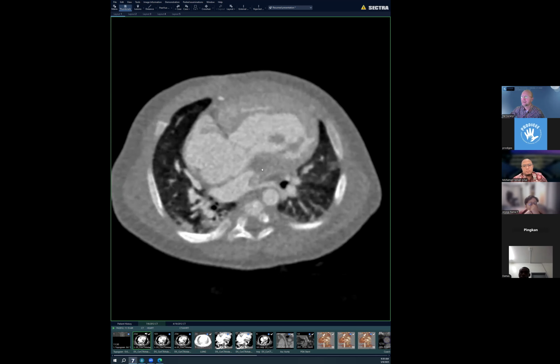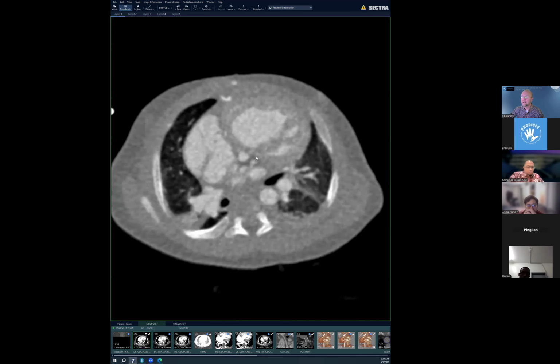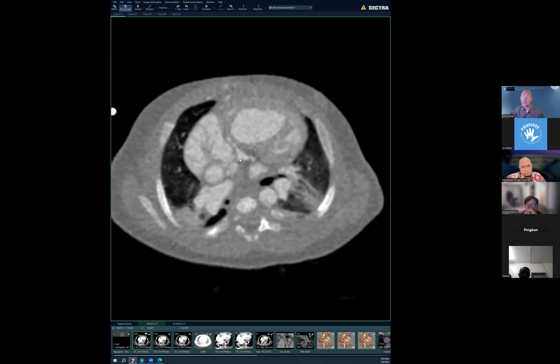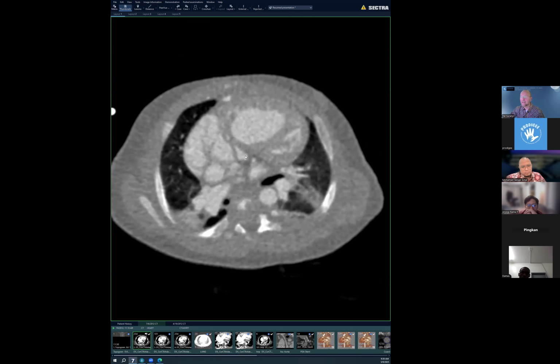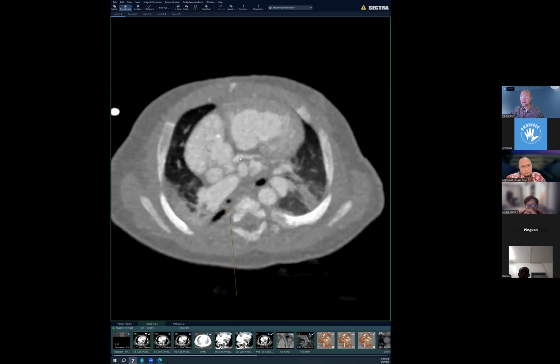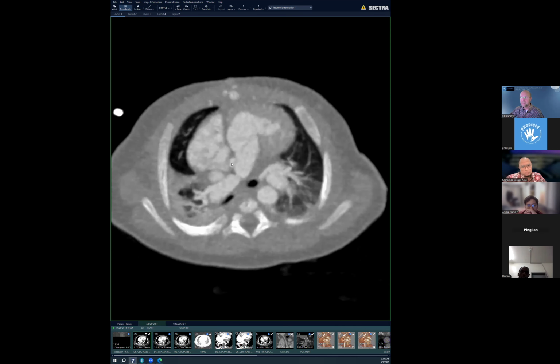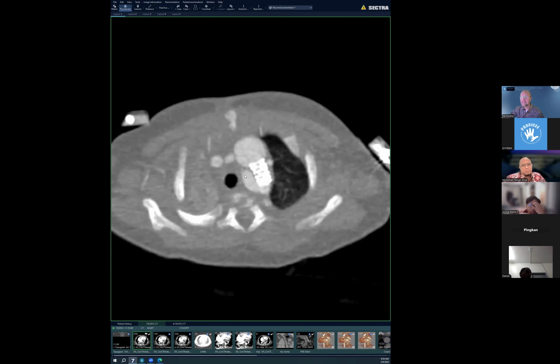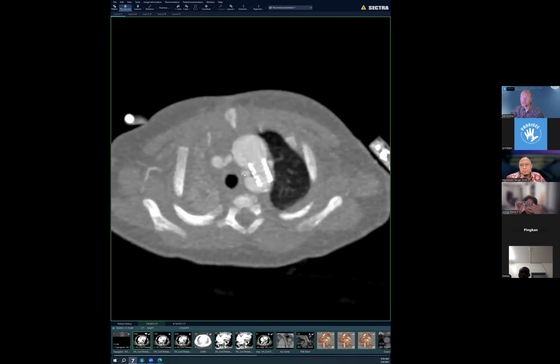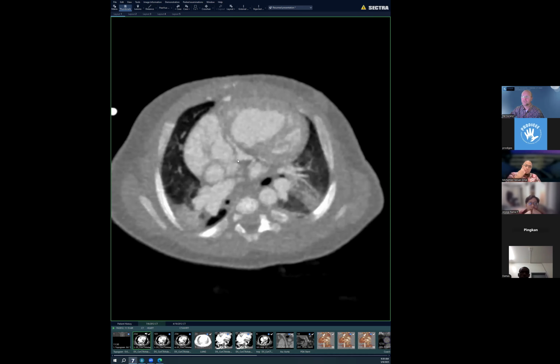And we're going to go around the circulation. We have aortic atresia, so we're trying to get out to the aorta, but there's no flow here. You can see the aortic root is very, very hypoplastic. You can see the right coronary and the left coronary there, and this very, very tiny ascending aorta, which in reality, in this child, is not really an ascending aorta, but it's a descending aorta because the blood flow is actually coming from this patent ductus arteriosus, and it's going to be flowing backwards, downwards, to the coronary arteries.